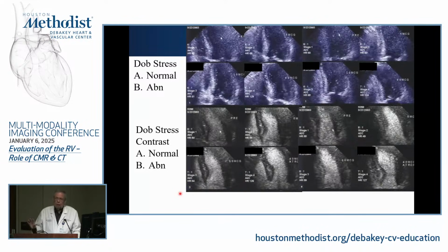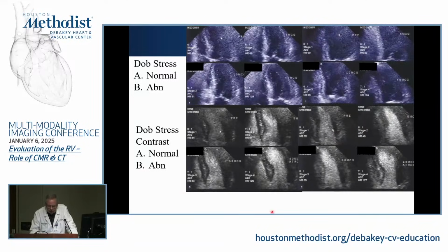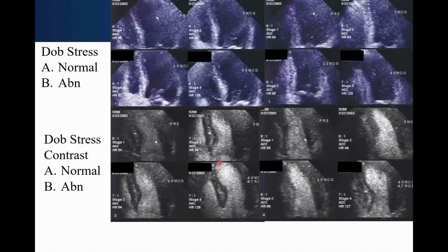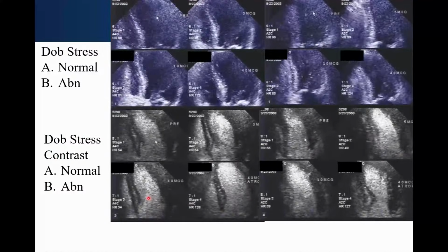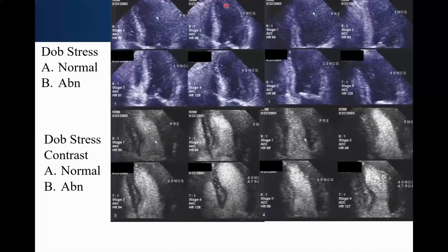You have seen a lot of contrast so far. So suffice it to say that we do use contrast a lot. You saw this case already. I showed you this patient because of the nice LAD abnormality. But look how nice this is here. I think probably a high school student would detect it. But look at how tough it would be here.